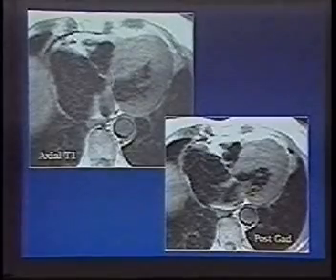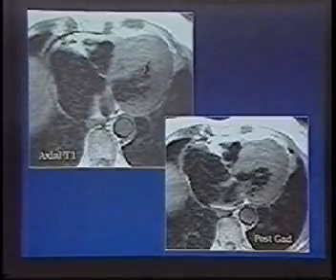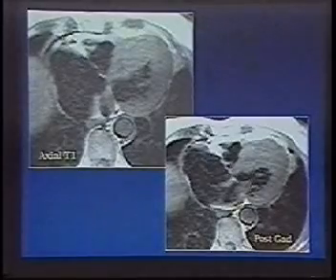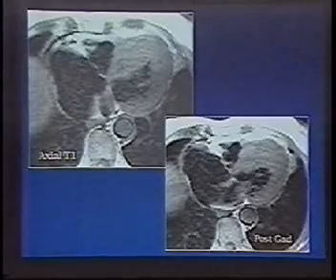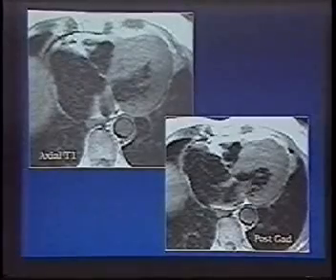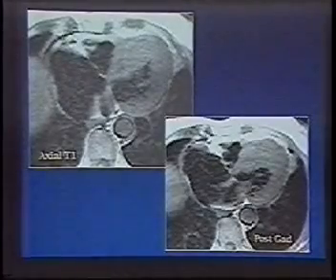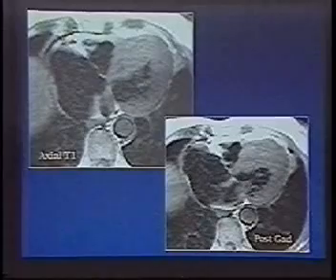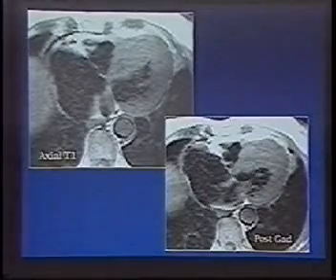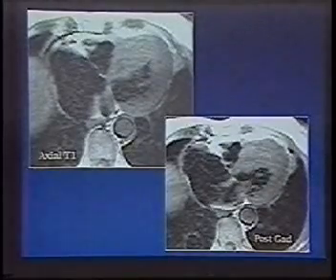And the differential diagnosis here is an angiosarcoma. Remember I showed you a case earlier with an angiosarcoma right in the middle of the septum. So a tumor or a metastasis that's sitting right in that septum. Now a 28-year-old woman, unlikely to have a malignant tumor. But in older patients, that could well be the case. And how do we differentiate? Well, what we do is do a post-gadolinium image. There's no significant abnormal enhancement in that area. This is hypertrophic cardiomyopathy. Malignant tumors should enhance intensely.